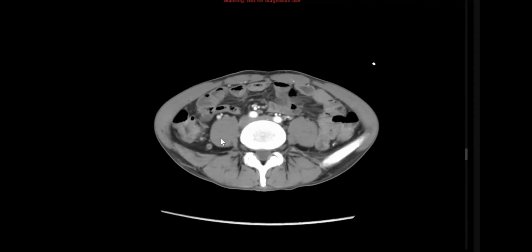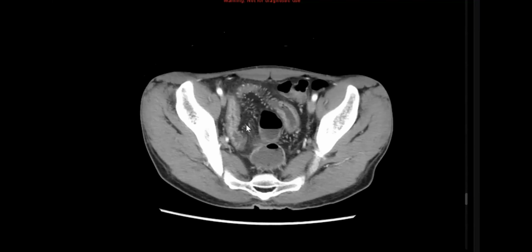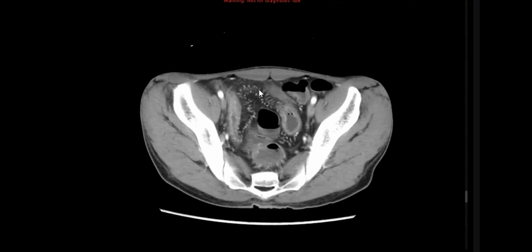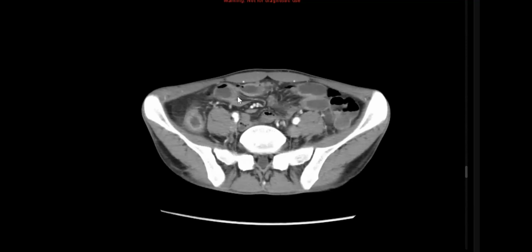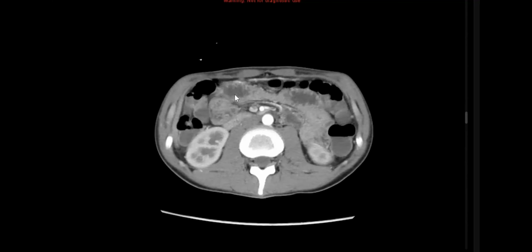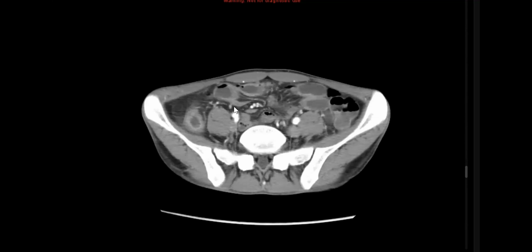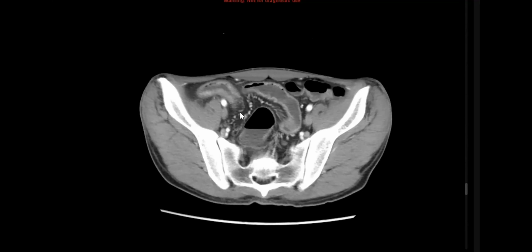Okay. So normal appendix, thickened, hyper-enhancing terminal ileum, smudging fat planes, and engorged vessels. It's comb sign. I'm looking upward, no other area of inflammation, so no multifocality or skip lesions should be mentioned. What else should you mention? Fistulous formation, abscess formation, or perforation.